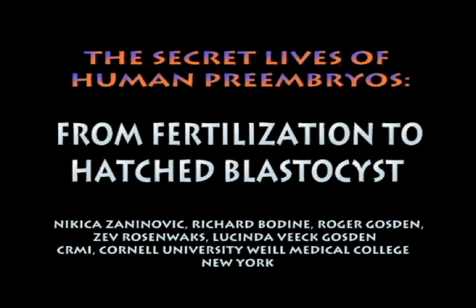Time-lapse live microscopy provides an opportunity to observe the dynamics of human embryo development in vitro for up to 7 days to the hatched blastocyst stage. We mounted a temperature and CO2-controlled incubator chamber on an inverted microscope, and images of embryos were captured every 3 minutes using a digital imaging system. Initial studies confirm that development of mouse embryos is as successful in this system as under standard laboratory incubator conditions.